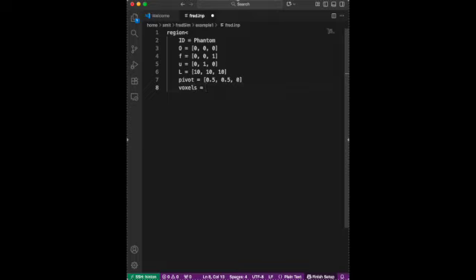Now the voxel, you can define it. Do you want to keep the voxel at 1 millimeter size, each voxel a 1 millimeter cube, or do you want to decrease it? How do you do that? The voxel size is given in millimeters, so 10 centimeters, that is 100 millimeters, divided by 100 voxels gives a voxel size of 1.